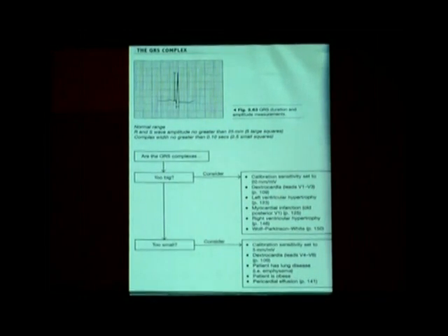Whereas if your P wave and QRS complex in V1 are abnormal, you have a tall R wave in V1. Your R/S ratio in V1 is more than 1, or the absolute height of the R wave is more than 7 millimeters in V1, especially when it is associated with right axis deviation and right atrial enlargement, the diagnosis is right ventricular hypertrophy. So whenever the QRS is big, it is either left ventricular hypertrophy or enlargement, or right ventricular enlargement. Once again, in this, pressure overload or volume overload, then according to the conditions.